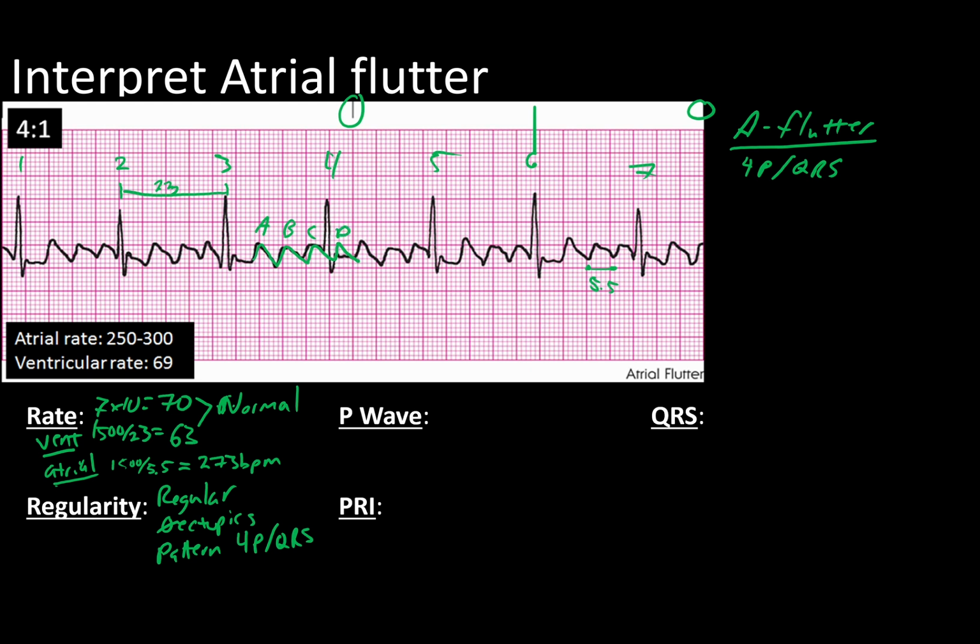In fact, the QRS canceled it out. So what we're looking at is the P and T combined, as well as the QRS concealing the letter D. And that's how you get to that.